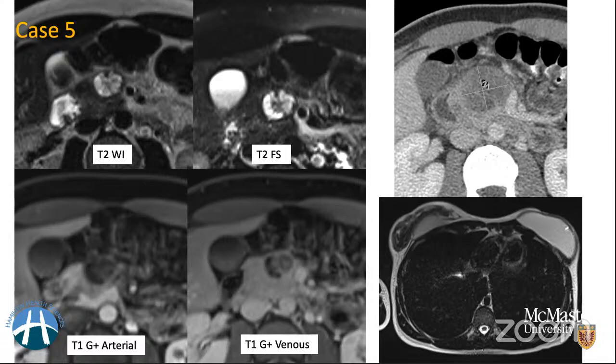Again, RCCs can metastasize, and that's why you should include an arterial phase when you are performing these surveillance CTs on patients who have had previous nephrectomies, because that is the only time you're going to see hypervascular metastases in the pancreas. But just something to remember, adding your differentials when you see multiple findings, some of them may be a history of prior surgery, and just something which will increase the list of your differentials. So I guess those were my cases, and then I'm going to hand it over to Amar.